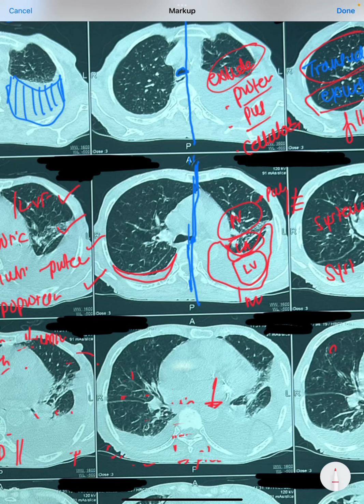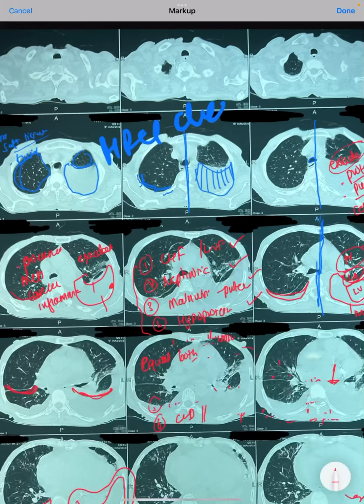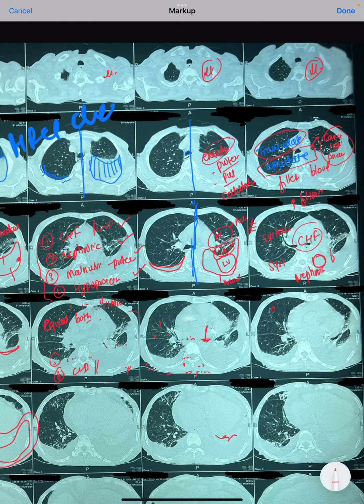There is almost a moderate pleural effusion because it is coming from the base of the lung to almost the apex of the lung. Here the apex is not visible on the left side because it is all filled with pleural effusion. So this goes more in favor of a local inflammatory pathology, and in almost 70 to 80% of the cases it is always pneumonia causing local increased inflammatory cells.